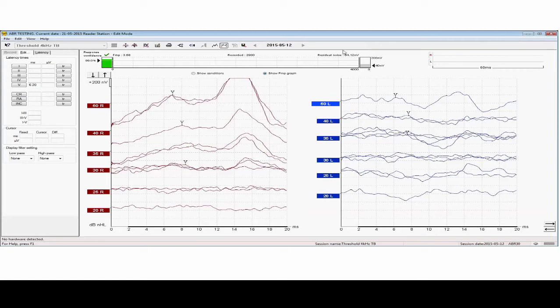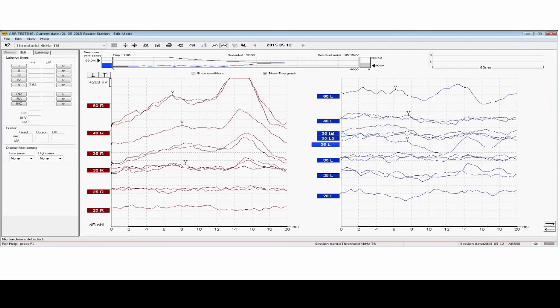If we look at the residual noise level, it is still somewhat high. It's not as low as we would like, but 64, it's not really bad. So if the person instead had not stopped the measurement and repeated it, but just let it measure for a longer time until maybe the residual noise level is also low enough, then I think the confidence would have been much higher. And the same I can demonstrate by looking at the 35 dB curves. The one I clicked on first has 2800 sweeps, and the other one also more than 2000, and the third one is also more than 2000.